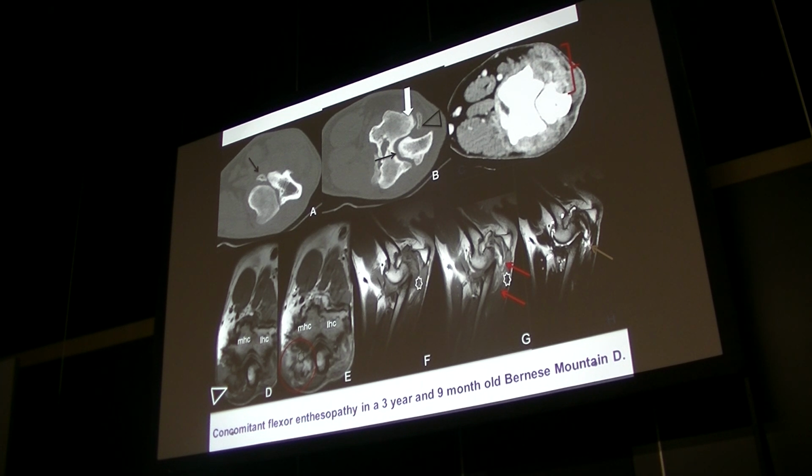These are MR images of the same patient, transverse, after IV contrast, a huge swelling, and also on the sagittal planes we can pick up the abnormal appearance of the flexor tendons, the heterogeneous signal in the muscles or in the tendons and between the muscles, even too much amount of joint fluid, and here we are able to pick up a small discrete lesion, which is a huge displaced fragment on the sagittal plane.